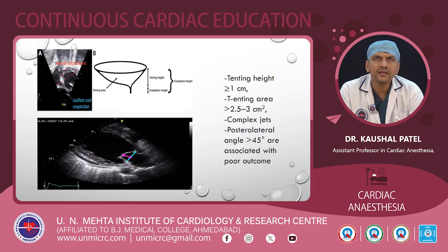As we previously said, the mitral valve annulus is a saddle-shaped annulus. The annular plane is in a different plane, and the coaptation point is just below the annulus plane. So from the annular plane we are going to see the coaptation point. That height is called the tenting height.